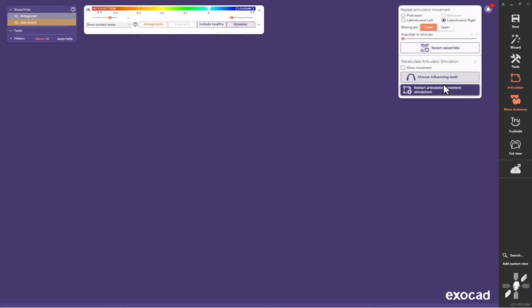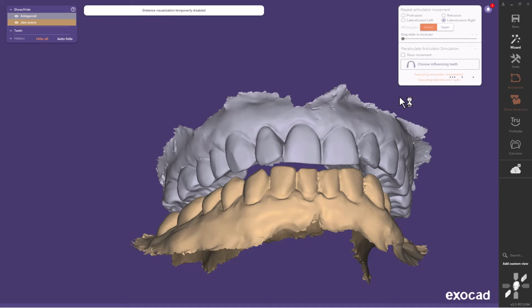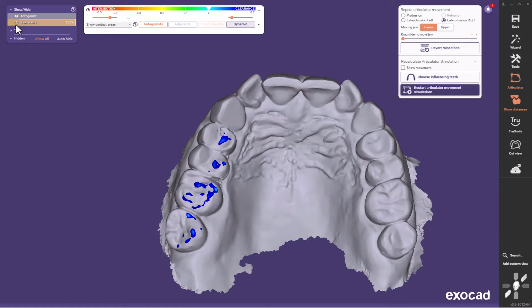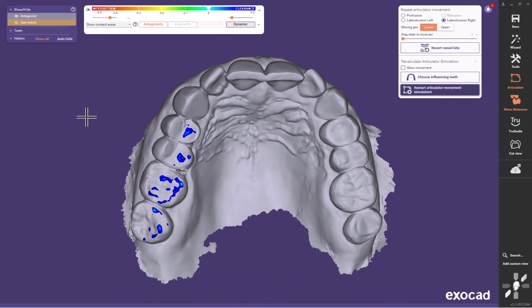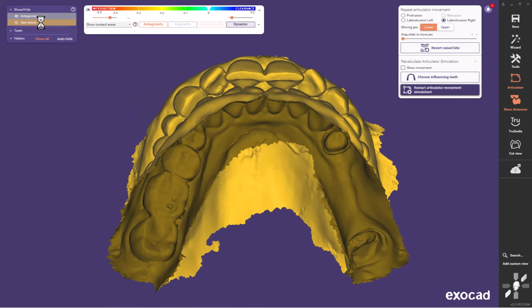Okay, let's rerun. Okay, so we're starting to get better contact. Let's work it just a little bit more.